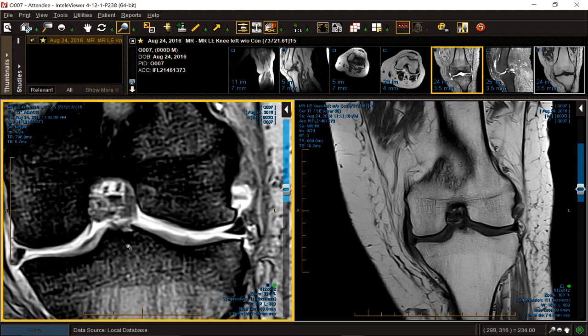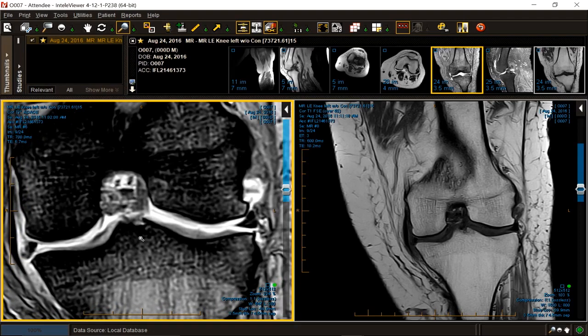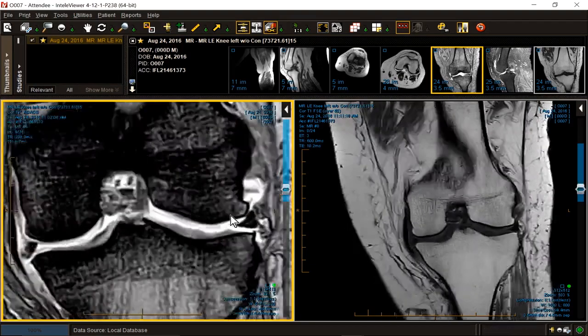It's weight bearing. So I might say that the patient has medial and lateral, generalized, grade 2 to 3, the all-purpose grade, chondromalacia. Can't see grade 1 very well. Because it's greater than 50% depth, it's grade 3. It doesn't penetrate the bone, so it's not grade 4. So 2 to 3, the all-purpose grade. I'm not pulling out each individual erosion. I'm going to say there's minor femorotibial malalignment or shift. There are mild osteophytes. So there's mild OA.